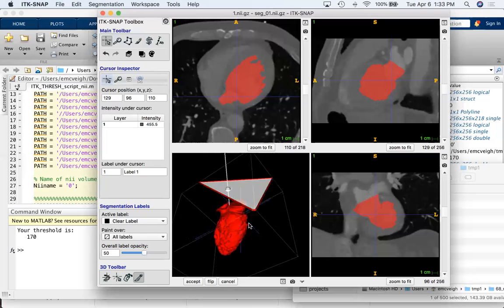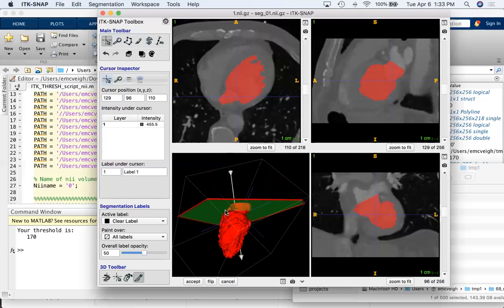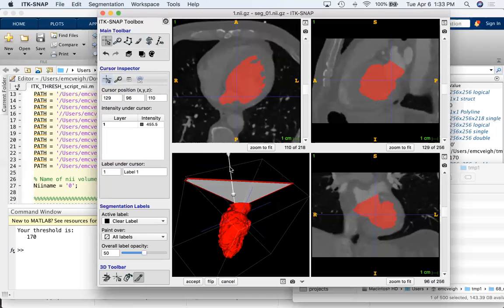everything. Yes, I rotate everything. If, on the other hand, you put your mouse on the plane like this, and then you click left down, it will make the plane green, and then it will drag it up and down, orthogonal to its normal. Okay. So it can drag down and up. And then if you go to the arrow itself and hold left down, it will rotate.